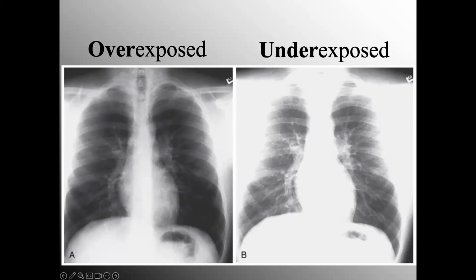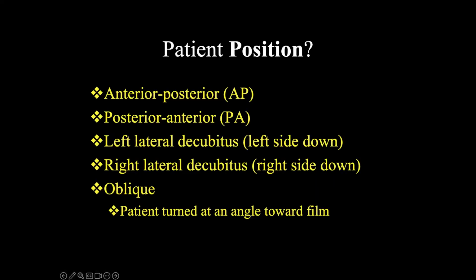All in all, just ensure that you're adjusting your chest X-ray contrast accordingly. Don't overdo it. When you're viewing it, it's to ensure you don't miss anything important or pertinent, but you want to be sure, if you have the ability to adjust the density, and most of us will on our computer-generated images, to do it with some caution and make sure you look at both sides of the equation.